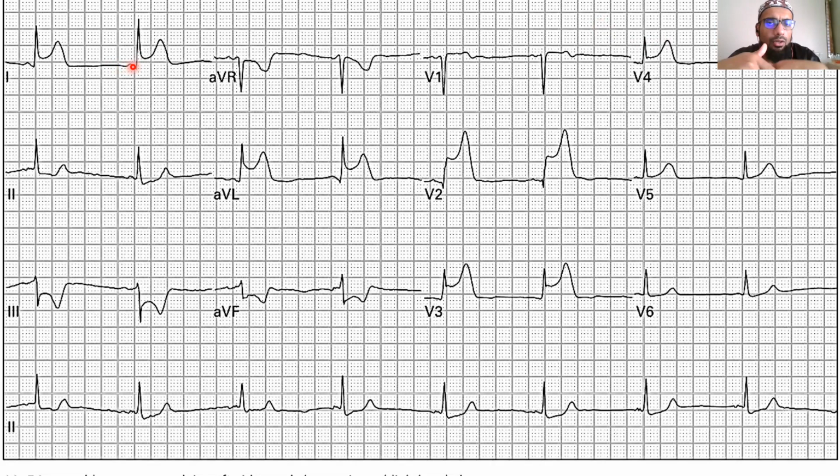So that tells us that this is actually coming from lower down. So we start thinking about ischemia already, vagal nerve damage, things like that. Why is this SA node not talking to the ventricle? However, the ventricle is receiving a signal from higher up, so it knows what to do.